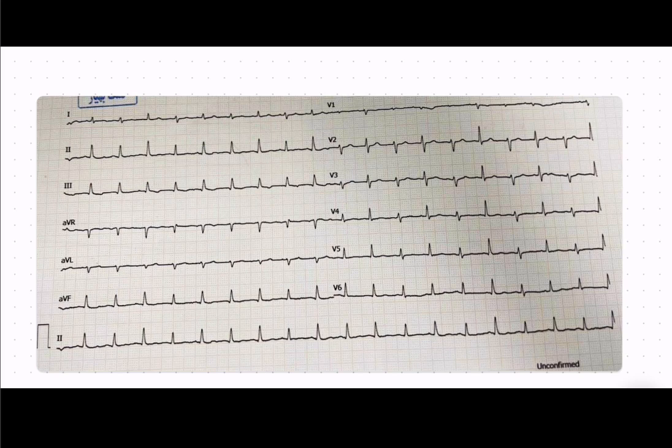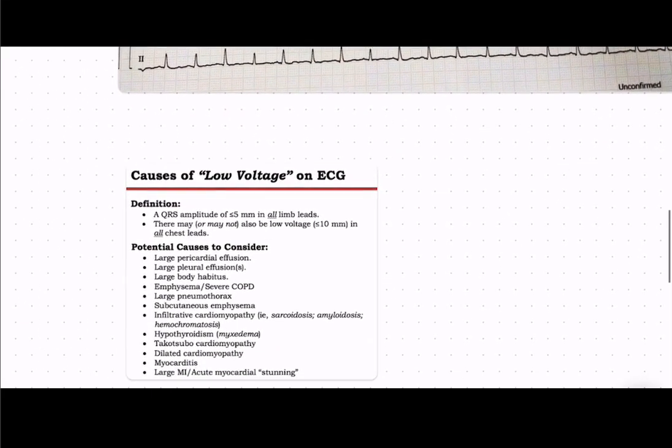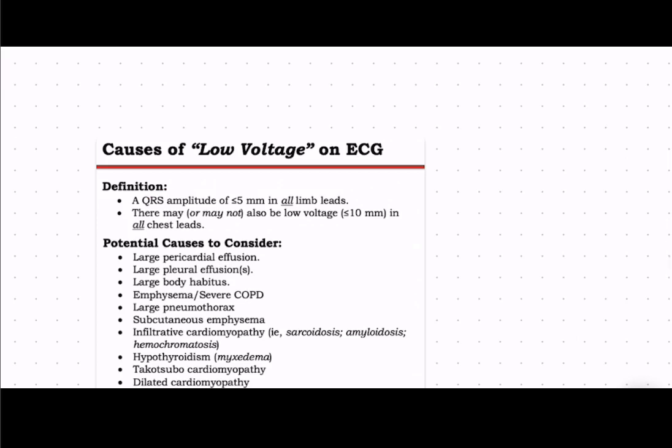As we review the ECG, focus on QRS complex. Observe the reduced voltage, suggestive of low voltage ECG. Although it may not fully meet the exact criteria for low voltage ECG, it's obviously lower voltage than usual. Let's quickly explore the definition and causes of low voltage ECG.